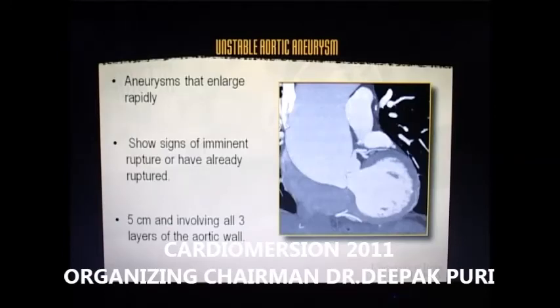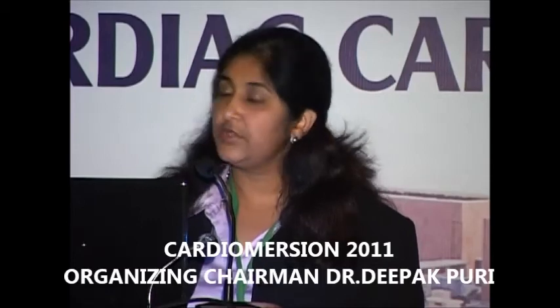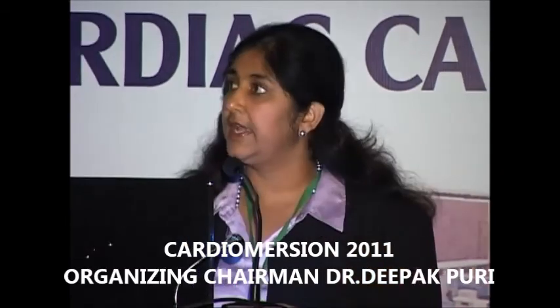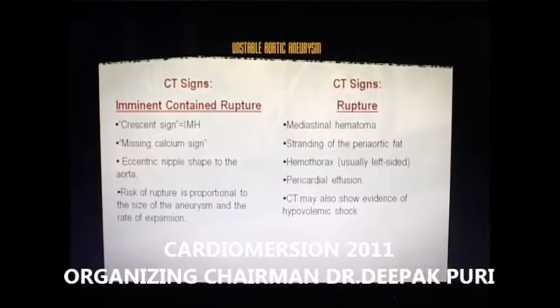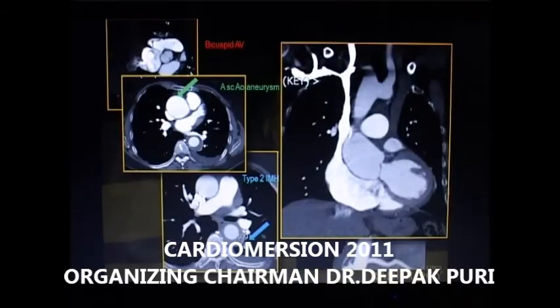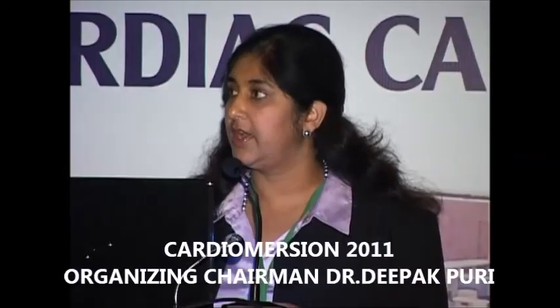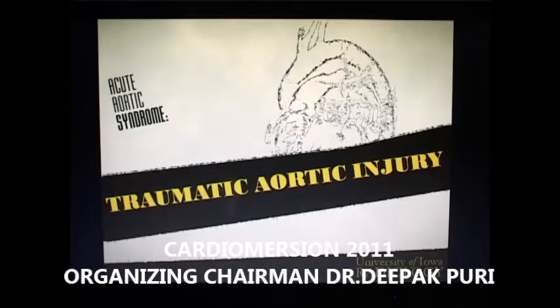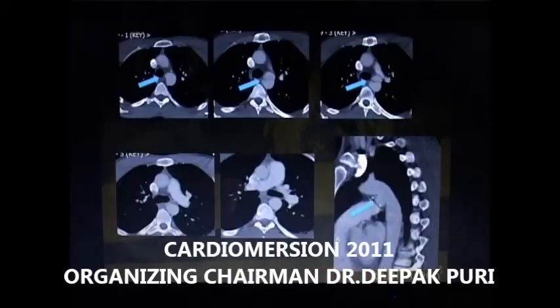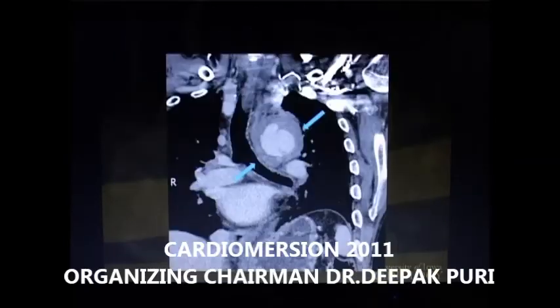Since I'm running out of time, I can share this talk with anybody who wants it. This is a large aortic aneurysm, demonstrating the size. MDCT and TEE are the basic 2 modalities which are used for evaluation for acute aortic syndrome. MR is for very special situations like contrast allergy, but usually not done. And imaging appearance is imperative. Mimics are very important to recognize because you definitely don't want to take anybody not having aortic dissection to the OR. And the optimal imaging technique is required.